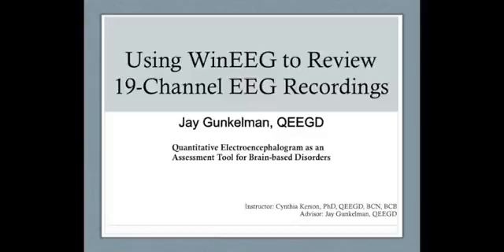This webinar, entitled Using WinEEG to Review 19-Channel EEG Recordings, is presented by Jay Gunkelman, and it is part of your course, Quantitative Electroencephalogram as an Assessment Tool for Brain-Based Disorders. It'll walk you through how to use the WinEEG software.